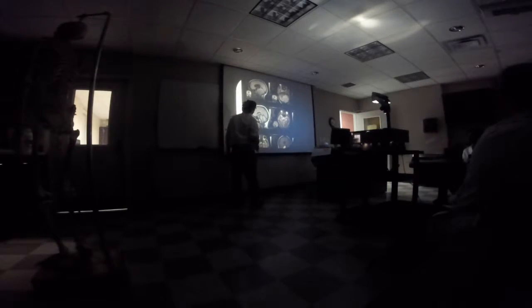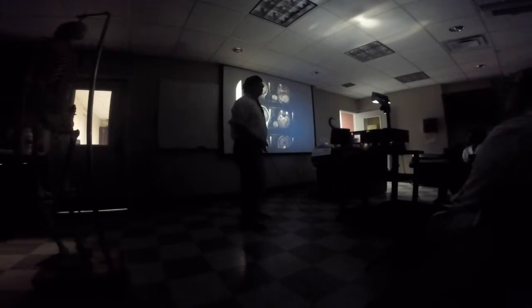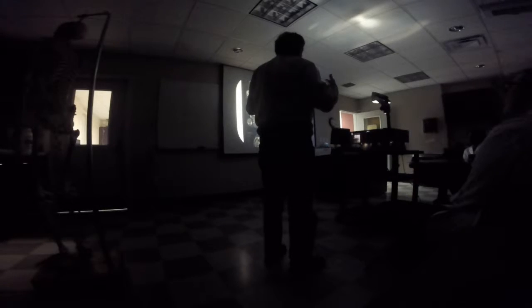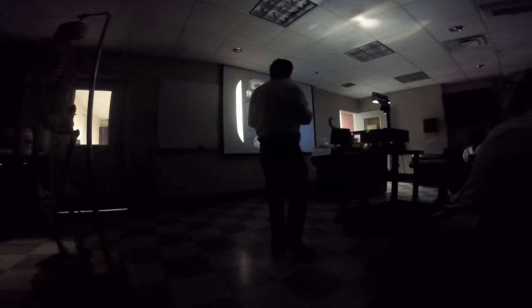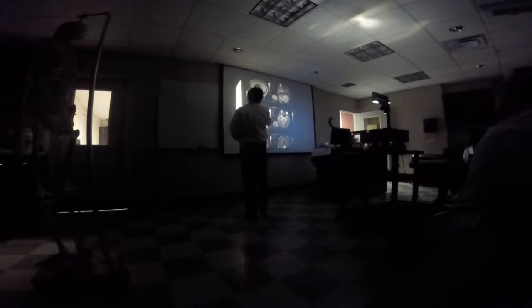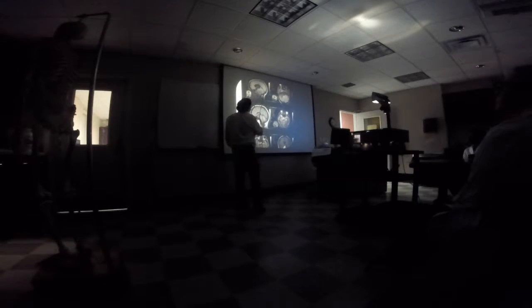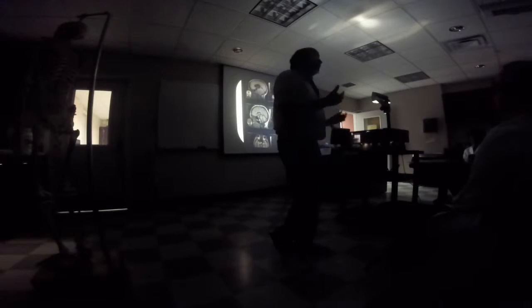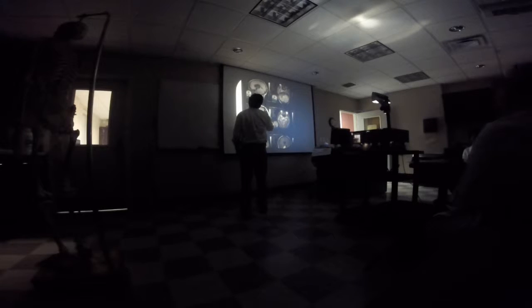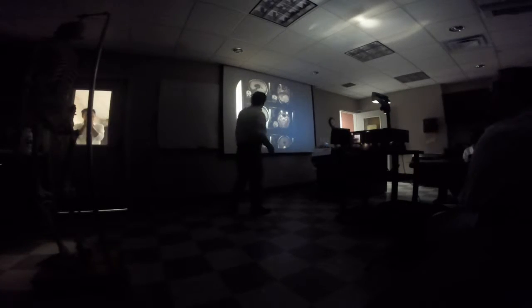In that picture you were just pointing to, would we be able to tell it was a tumor? Yes. The architecture's distorted. It's way too big. It's compressing the opposite hemisphere. I mean the one on the top left. Can we tell from this one right here? Yes. How do you tell from that? Because you see a mixed density here. There's hyperdensity and there's hypodensity. The one below that, you wouldn't be able to tell. Okay, that's why I was confused.